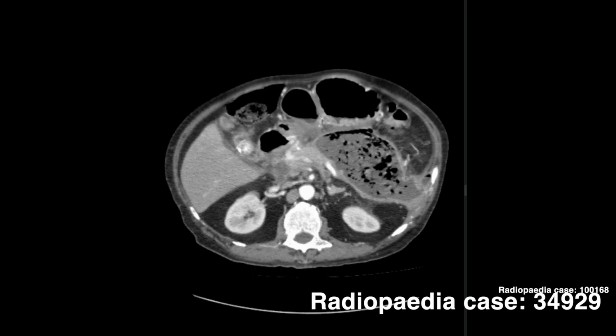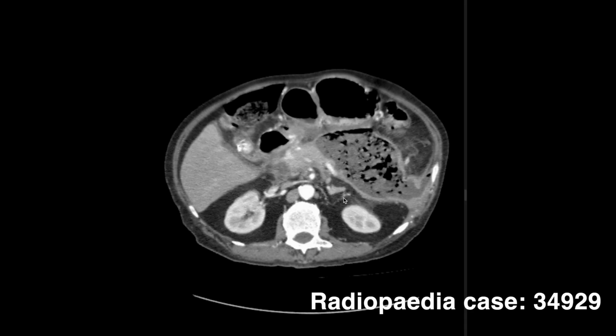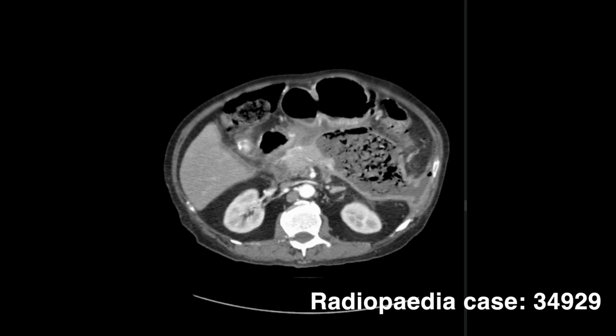Now, a different scenario. This patient had a severe episode of pancreatitis weeks ago. This is the follow-up CT. Something still is not right. Look at this collection. It's massive, sitting right where the pancreas should be. First thing, does it have a wall? Yes. Thick, defined, encapsulating wall. That tells us we are beyond 4 weeks. This has matured. Now the critical question, what's inside?